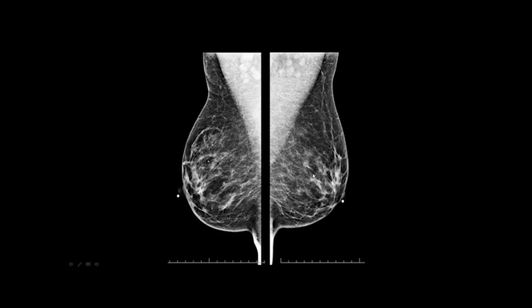The breast parenchyma patterns are wide, separated. You can see structures. There's no summation. Beautiful IMFs. They're clearly seen. The nipples are in profile. This one not as much, but it's not bad. It's still in profile. So if these didn't have the clip, I would definitely send something like this in for accreditation. It's very nice. The parenchymal patterns are horizontal, very well separated. Beautiful, beautiful positioning.